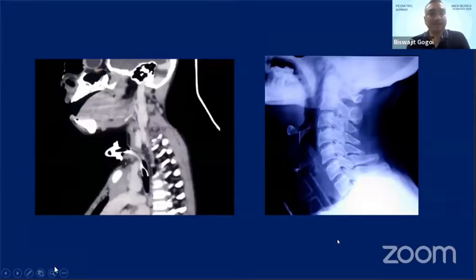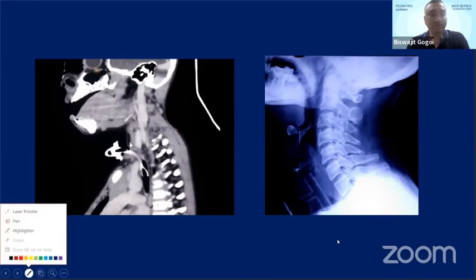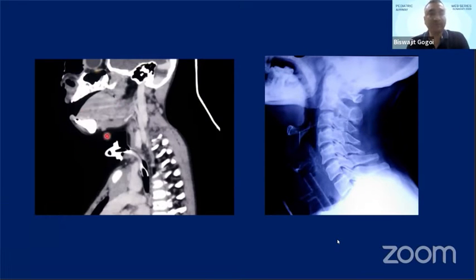And from the airway perspective, I want to share two X-rays here. One is an X-ray lateral view of the neck for a tracheostomy child with a decannulation issue. If you can appreciate in this X-ray, it doesn't require a very high resolution CT or MDCT, and you can appreciate what is in his airway. And in this position we can appreciate that he has a collapse, that means suprastomal collapse here.